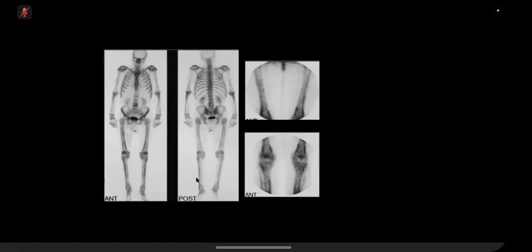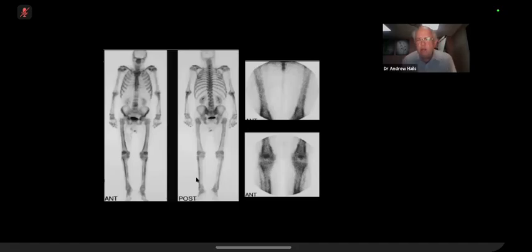I would obviously in clinical practice correlate with any plain film to see if there was any aggressive periosteal reaction, but given the symmetry and the context of edema, could this be venous insufficiency or edema? That's not a bad idea. You can get something similar with venous insufficiency. Probably it actually goes up a bit here into the femur.